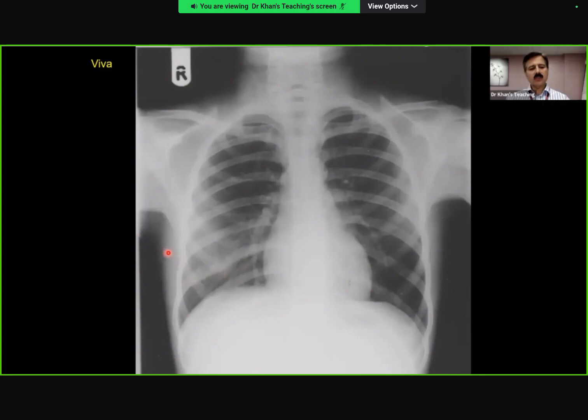Do you look at this soft tissue versus this soft tissue? Any difference? Yes, on the right-hand side, the soft tissue is increased. What is your conclusion? So I'm concerned about a chest wall lesion, a soft tissue sarcoma of the chest wall, in my 2 top differentials. What is the age of this patient? So the epiphyses appear to be closed. We don't have much degenerative change. Look at this one. Look at this one. All right. Okay. So they're open.